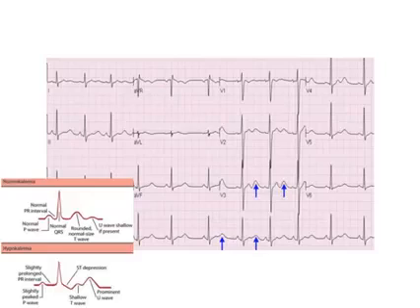Now, the reason that this is high yield on USMLE and Comlex is because if they're going to show you an ECG with hypokalemia, they're probably going to have you tie it in some way into a pathophysiology question or a pharmacology question asking you about hypokalemia. So if you see this, they're going to ask you an associated question, which probably has to do with the cause of somebody having a low potassium. So this ECG is often used to tie in high yield associations, which is why I've included it in this lecture. It's extremely high yield. So you see those U waves, it's hypokalemia. Start to have your brain think of causes of hypokalemia because that's probably where the question is going.